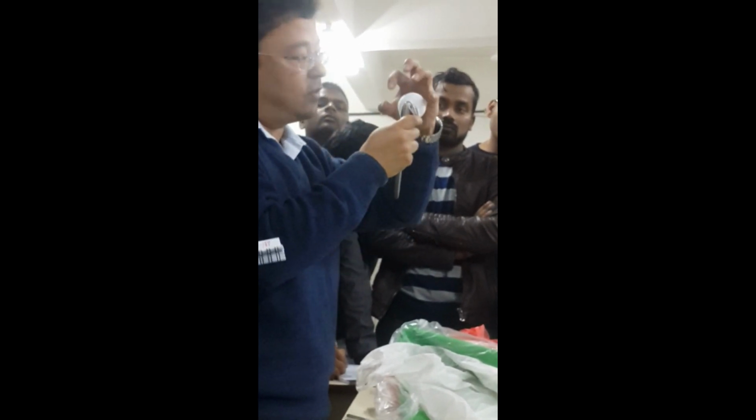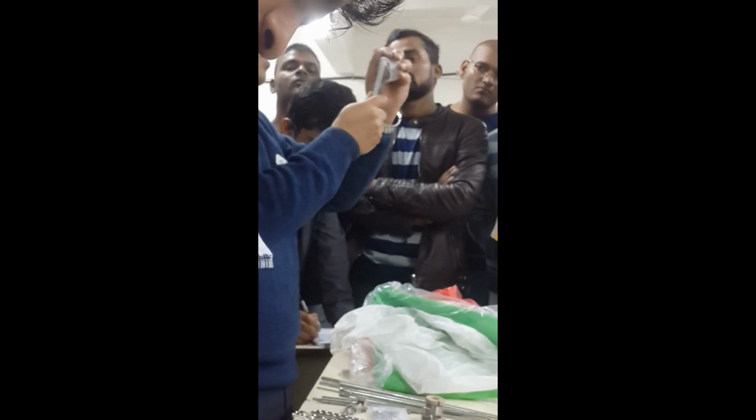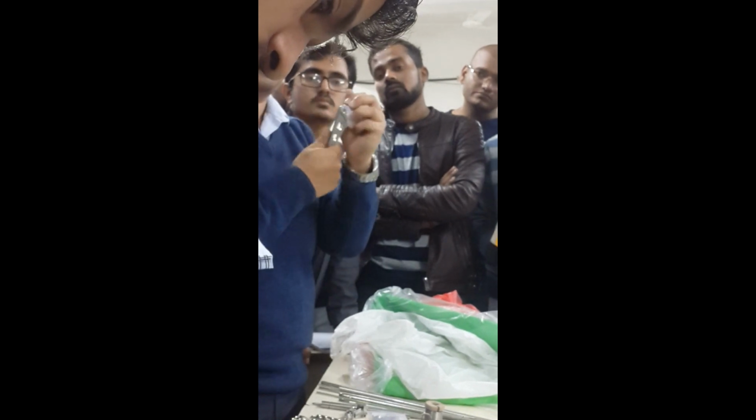But even in this, there is something known as the bipolar prosthesis. The head is already there, and over the head there is another component that moves like this. They say that it has a better outcome, but ultimately the component that moves freezes and becomes one component. Okay. So that is the bipolar prosthesis. With this we finish the implants.